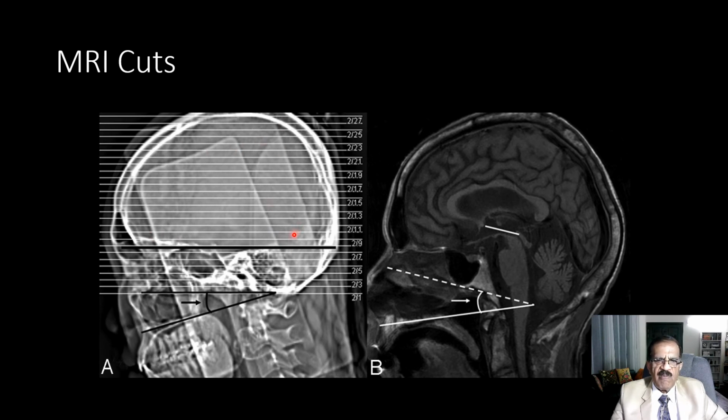This will be very helpful to orientate yourself and to read the images better. This is the nasal cavity, teeth, and pharynx. This is MRI, a normal MRI, and one thing you can learn on an MRI is the normal structure. This is also very good, but I'm going to show you the normal anatomy in another slide.